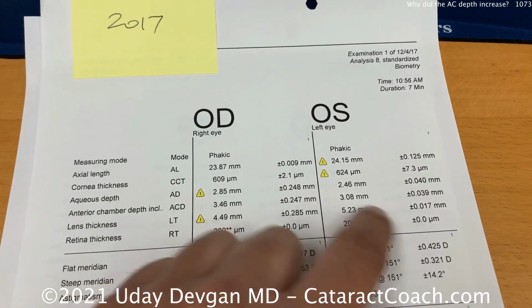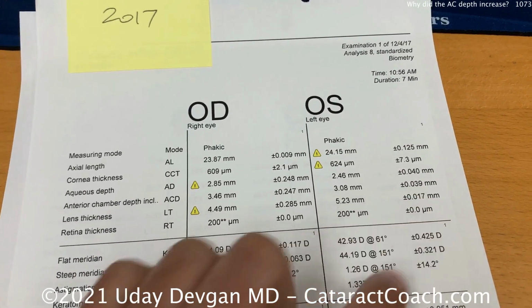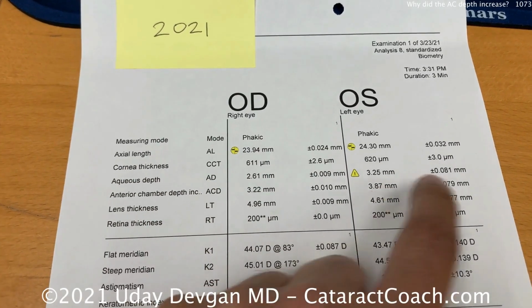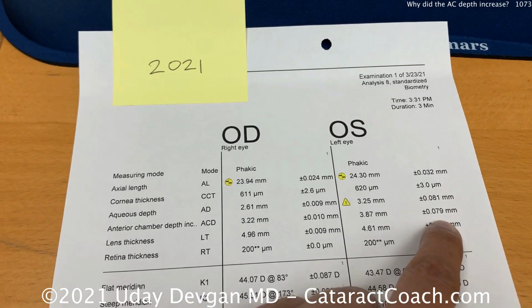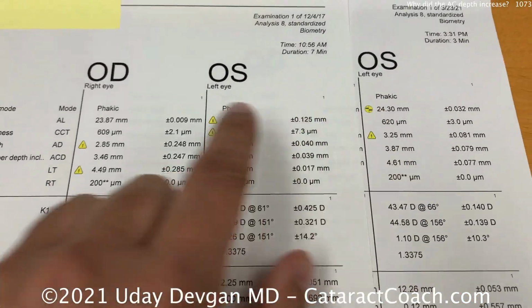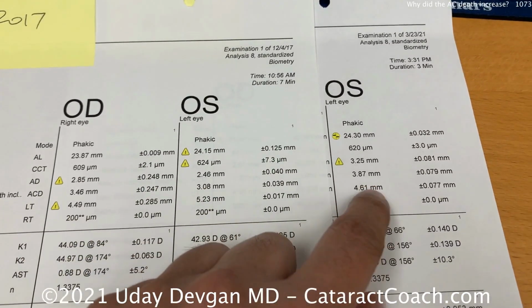Now on the data here, it looks like it was an accurate measurement. All 5 measurements were about the same in 2017. So what caused the anterior chamber depth to become so much deeper? He still has the same cataract. He's not pseudophakic. And the answer is the patient had a vitrectomy. He had a pars plana vitrectomy. And as a result, you can see he went from a 3.08 anterior chamber depth to 3.87.